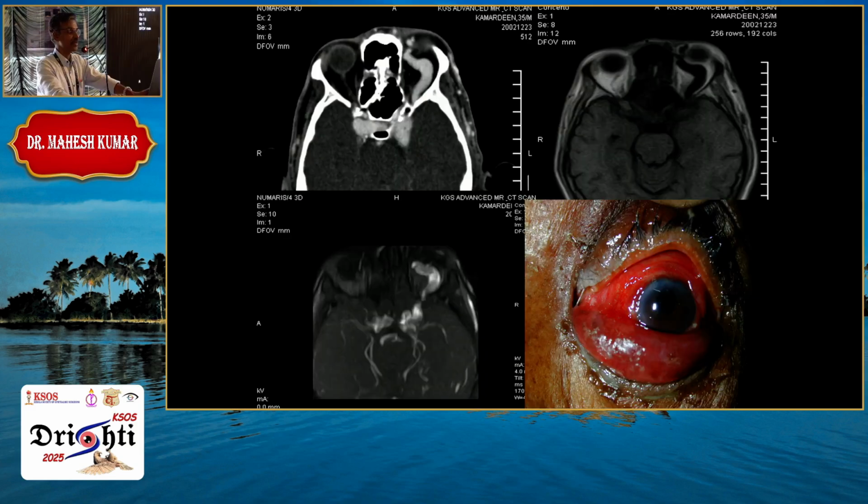Now again this has been described. Dr. Sai showed one beautiful dilated superior ophthalmic vein. For us ophthalmologists, we should know that the SOV goes from lateral to medial in the upper part of the orbit. This is a very gross finding, but we should also be able to identify any subtle proptosis, subtle or indirect CCF. This is a gross CCF, you can see the dilated SOV and the chemosis. This is a case of direct CCF, usually due to trauma.